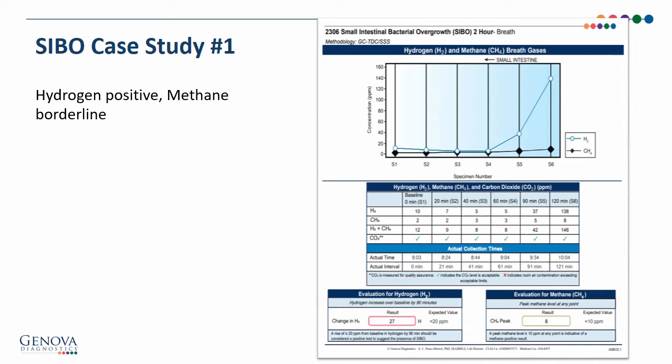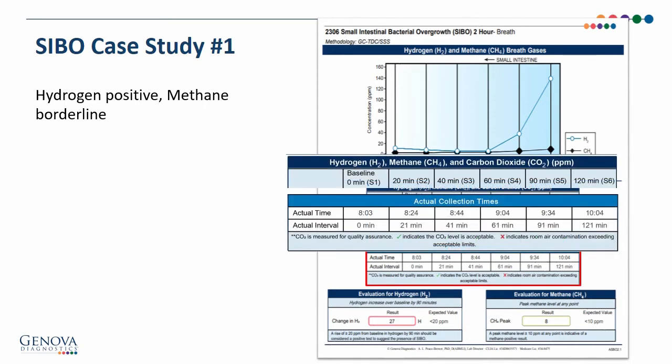We can only estimate. It's also important to look at the actual collection times in the middle of the page and compare to the top of each column. The patient pretty much collected on time.